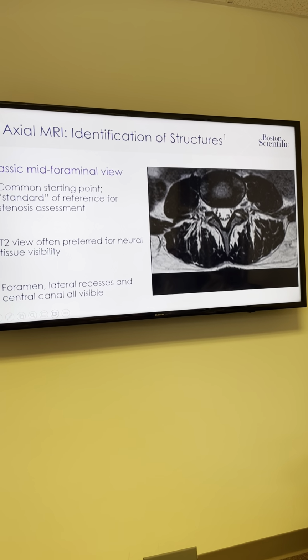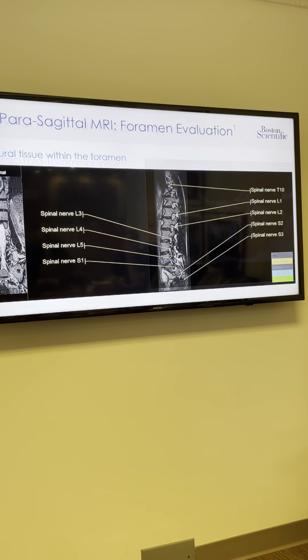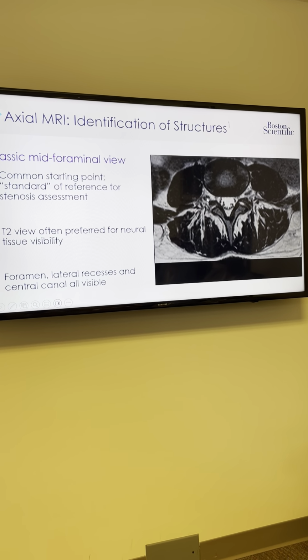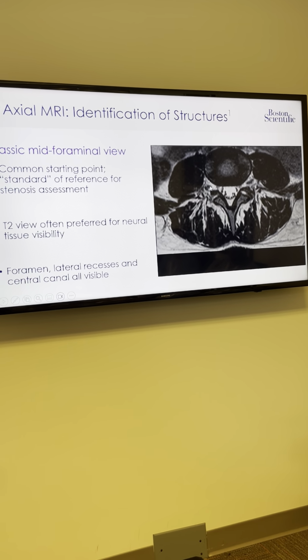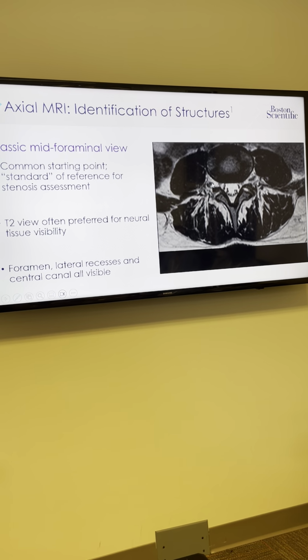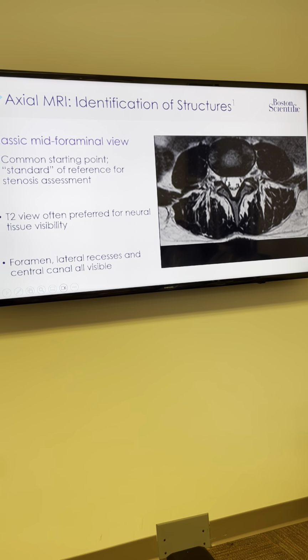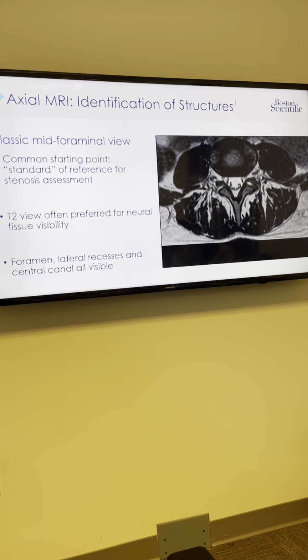The second thing that we will do is assess 4 specific nerve roots. One, the exiting nerve root on the right. So L3-4, this would be, Kyle? L3. L3, okay, very good. Left L3, right? And then in the lateral recess, Mike, it would be 4. 4. The traversing nerve root. It is right. The traversing nerve root would be 4.